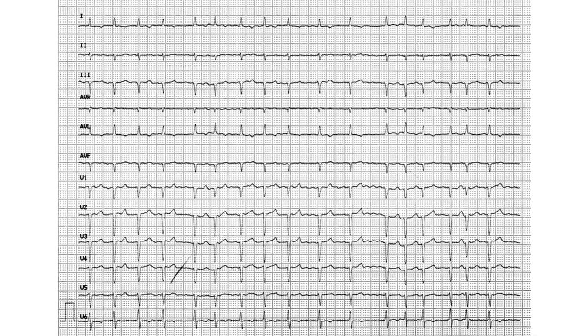I'd ask if you're ready, but I wouldn't be able to hear your answer. Okay, so starting off, instantly we check, is it regular or not? So we start off with the notepad file. I scan this through the sliding paper technique. This is irregular. Looks irregular to me. Debatable. Yeah, here definitely irregular. No, this is irregular rhythm, undoubted. Okay, so that's point 1.